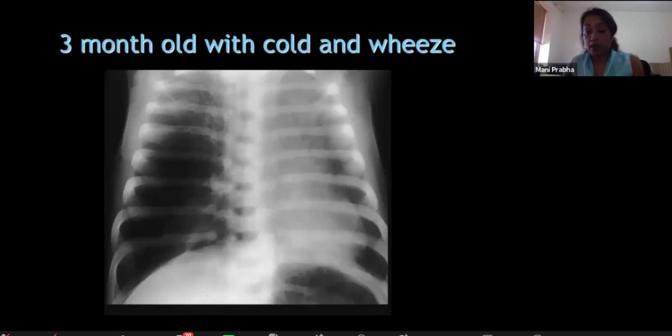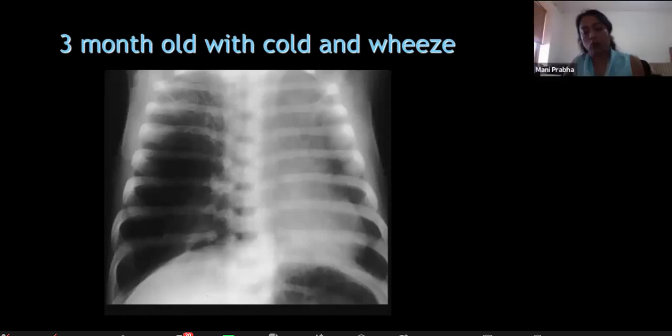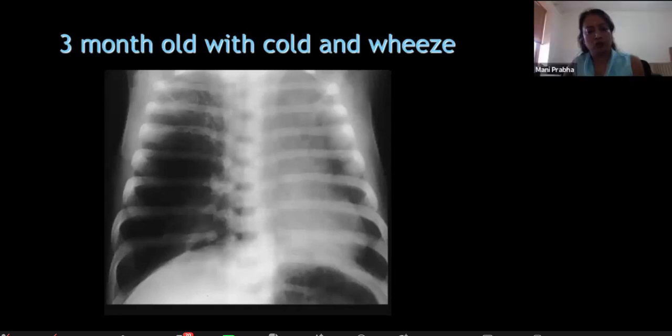So the pneumothorax should be... Yeah, the hemidiaphragm is quite distinct, and with CPAM, I'd expect a multicystic appearance. Yes, yeah, that's true. So it's unlikely to be there. So two main differentials in this one should be lobar emphysema and pneumothorax, isn't it? Yeah. So you would proceed for cross-sectional imaging, or what would you do next?